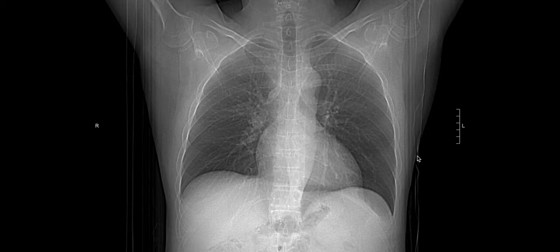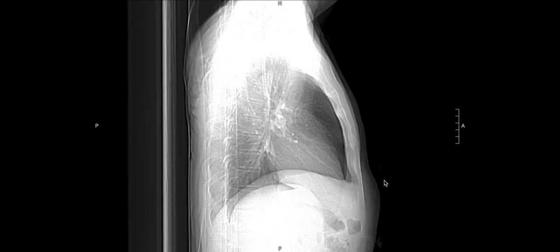So it's important, you can do a similar search pattern to what you would do on a chest X-ray, where you start with the soft tissues, looking all around. Then you can look at the bones. Then you can look at the airway, the mediastinum, the heart, diaphragms, the upper abdomen, and you can be really systematic. Similarly, don't forget that oftentimes there are lateral views as well.